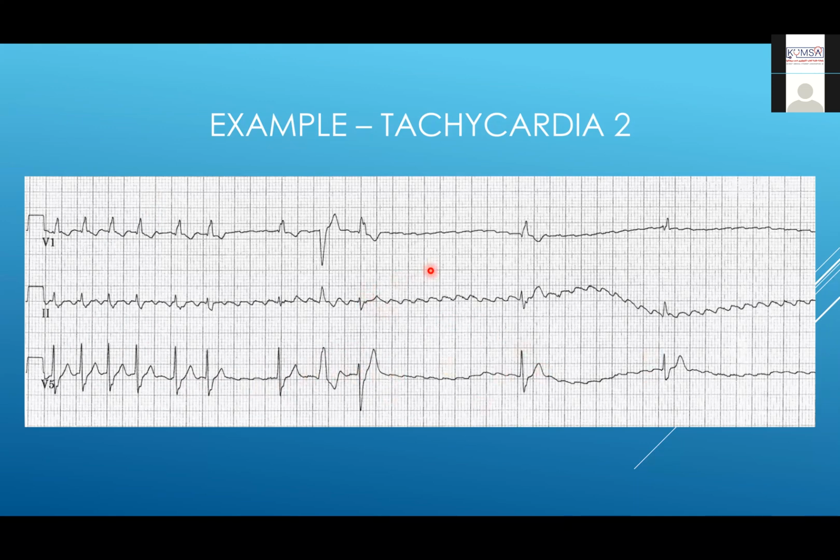So you can assume that this is an SVT, and atrial flutter is a cause of an SVT. But it's not the classical AVNRT or AVRT. This is an SVT, but it's caused by an atrial flutter. You see that sawtooth pattern showing up after we gave him some medicine to block the AV node.